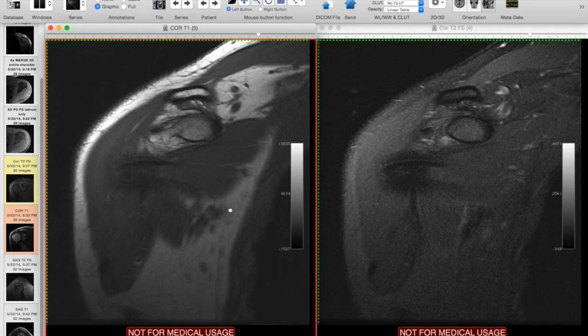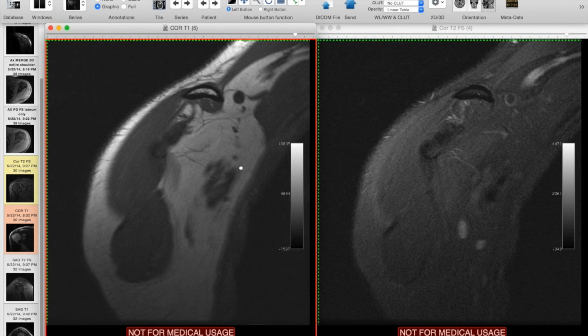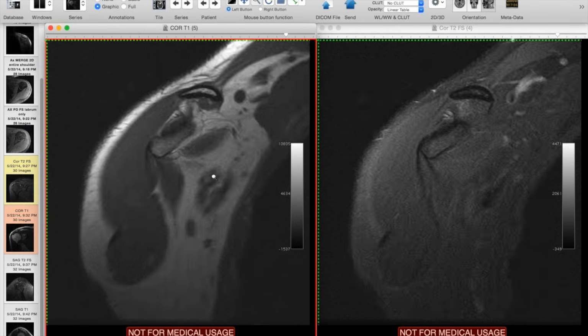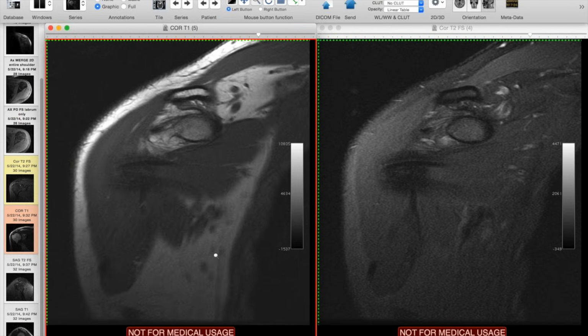The other thing you want to check on is just going through the axillary area and looking at the vessels there and the extent of the nerves that you can see. A lot of patients have some small normal lymph nodes.